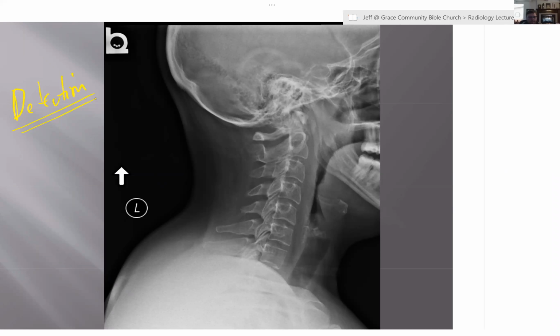Is there a decrease in the anterior airspace? Wow. Okay. What's your number? Let me wire you some cash because you are right. Now take a look. Good. Take a look here.